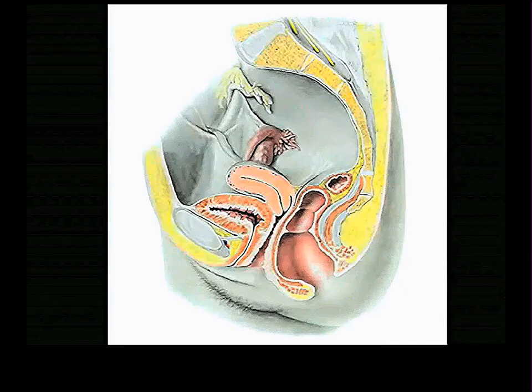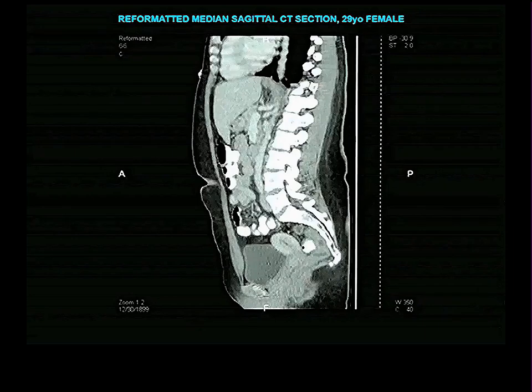And we're not going to see that many things. We're going to do some vasculature, which is not illustrated here at all. In terms of soft tissue structure, we're going to see essentially the ovaries, fallopian tubes, uterus, both body and cervix, and vagina. We'll see in front of the uterus and vagina, the urinary bladder. Maybe we'll catch the urethra, and behind those things, the rectum.